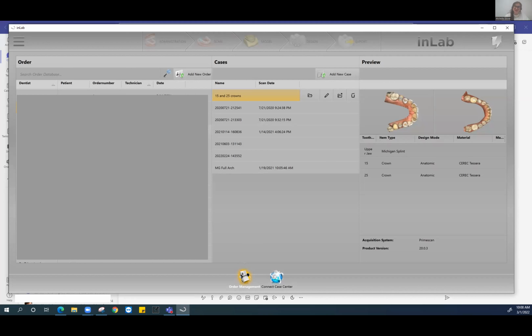And once you connect yourself with your lab account, the same thing can be said. You will be connected at that point to yourself from both your clinic and lab aspect.